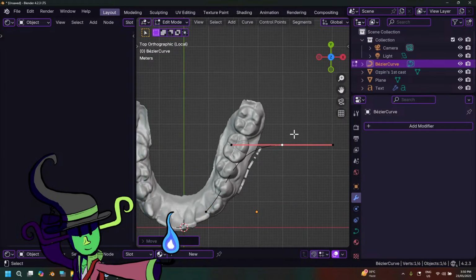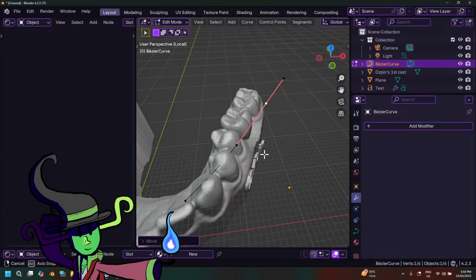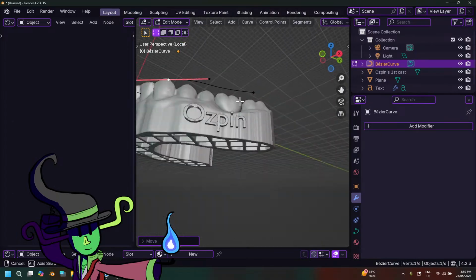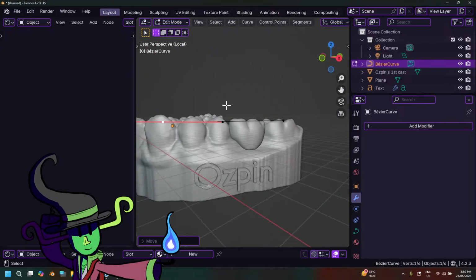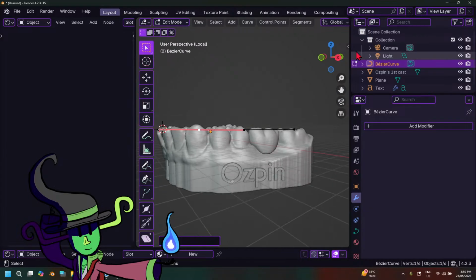If I just do this, I change up the... Let me try to have this conform with the angle of the thing here. Let's get the snapping tool here.